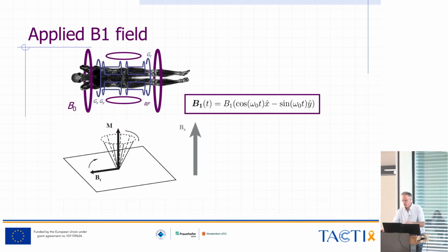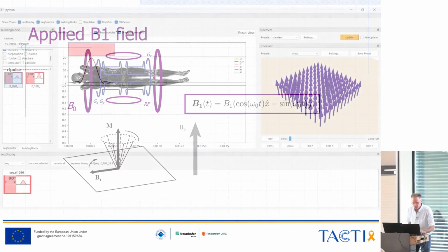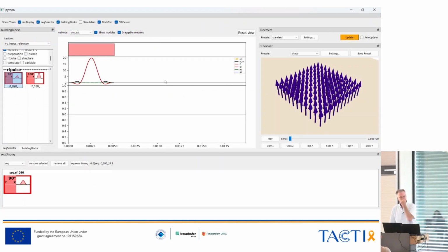So if you have zoomed out, you can click on Reset View, and then it will zoom in a bit so that it's a little bit easier. Switch the screens. Oh, that's a good point. Thank you. Yeah, that's something I have to memorize. You can click this Reset View, and then it will zoom in if you have zoomed out too much.